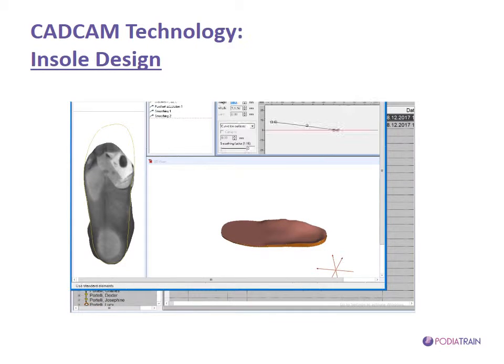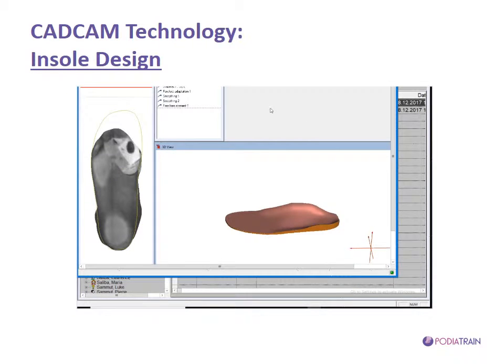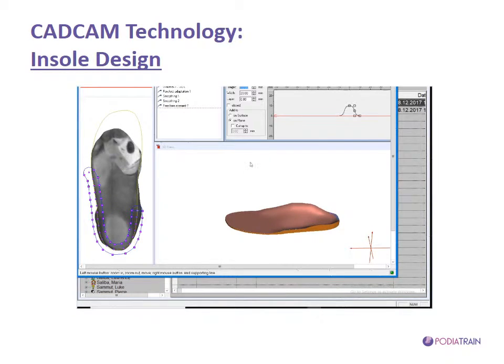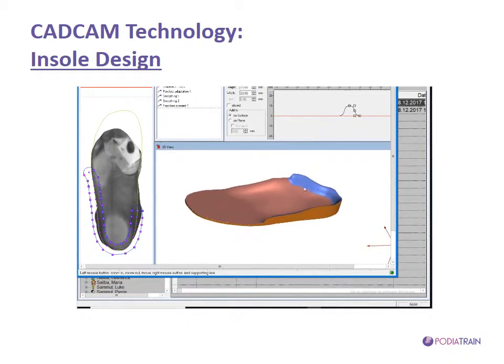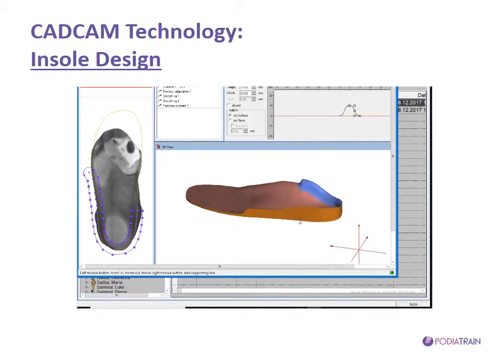Next step is to produce a basic medial longitudinal arch support, which is necessary since the insole was extremely flat. So the next step is to produce what is known as a heel dish in this software. A heel dish allows us to produce an area around the posterior aspect of the heel, as one can see, and around the lateral and medial border, in order to be able to cup the rear foot.